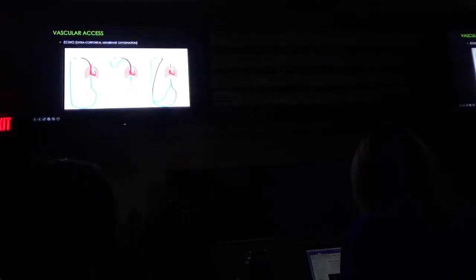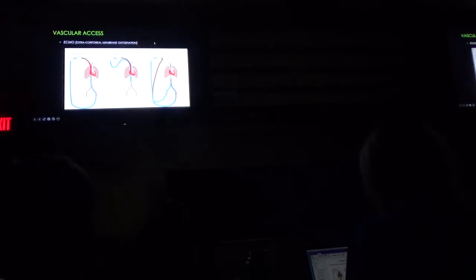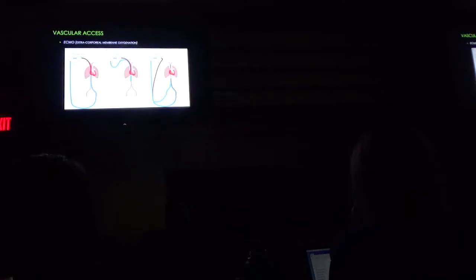All right. This is an example of an ECMO, what the vasculature looks like. Again, I have no knowledge of this. I've never encountered it. Don't expect you to know it. Just wanted you to see that. Also, I didn't make this. So I think Dr. Femoral went way into too much detail and kind of blew all of my students away last year. So I'm simplifying it for you guys.